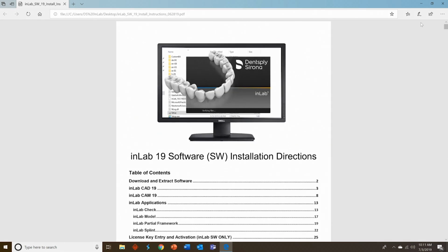I hope you have found this video helpful with the new process and that you find it easy to use and a much faster, more automated way to get inLab Software 19.